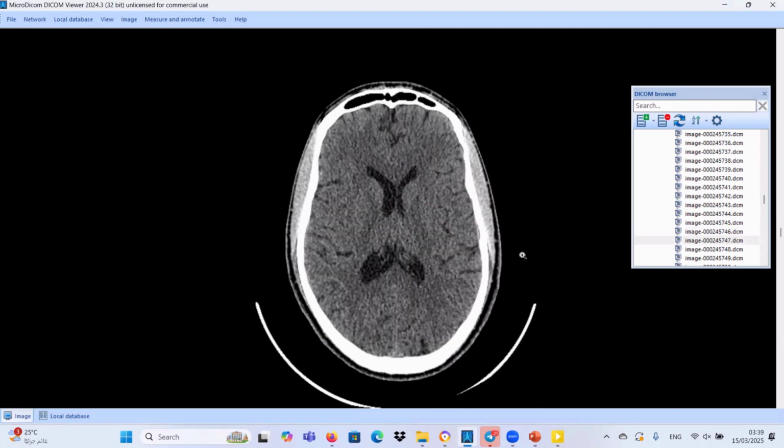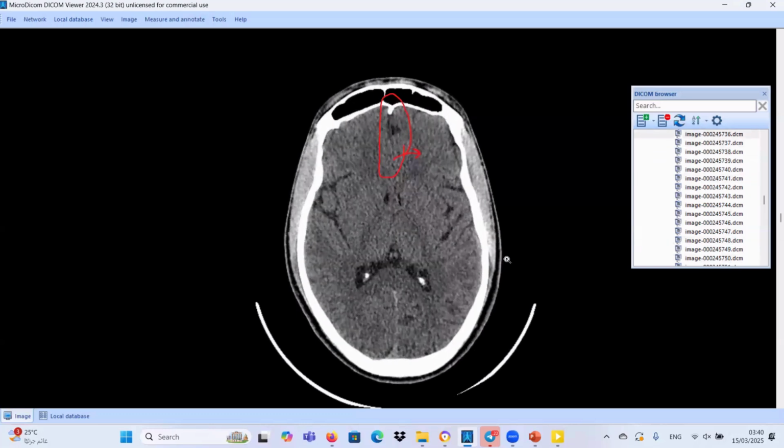I want to emphasize one important tip. Sometimes the subarachnoid hemorrhage along the interhemispheric fissure, arising from the ACOM aneurysm, can extend intraparenchymal into the frontal lobe. And in case of subarachnoid hemorrhage along the middle cerebral artery and the Sylvian fissure, if it is very extensive, it can extend into the temporal lobes. So it is not common, but in some cases subarachnoid hemorrhage can extend to make parenchymal or intracerebral hematomas, as we discussed.